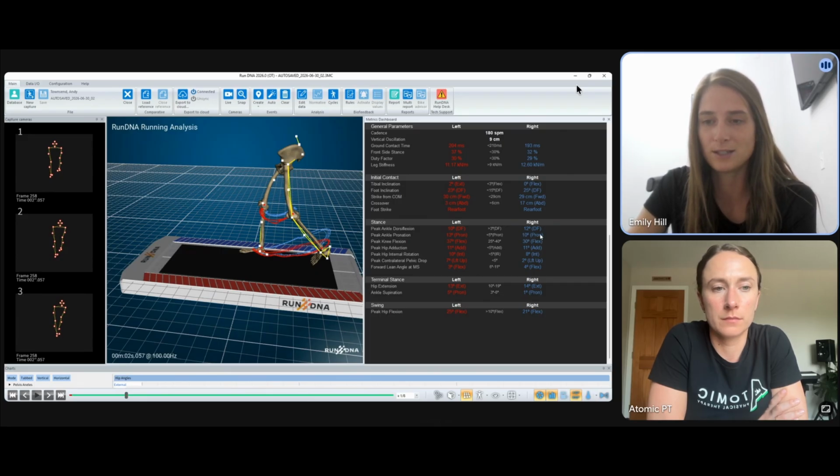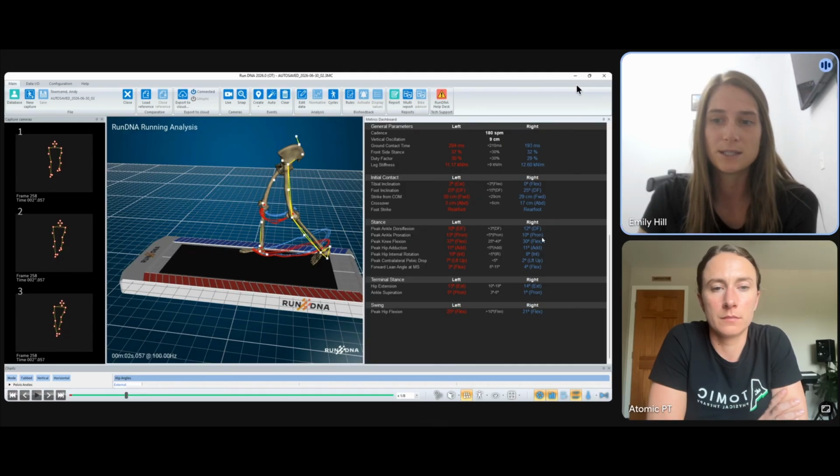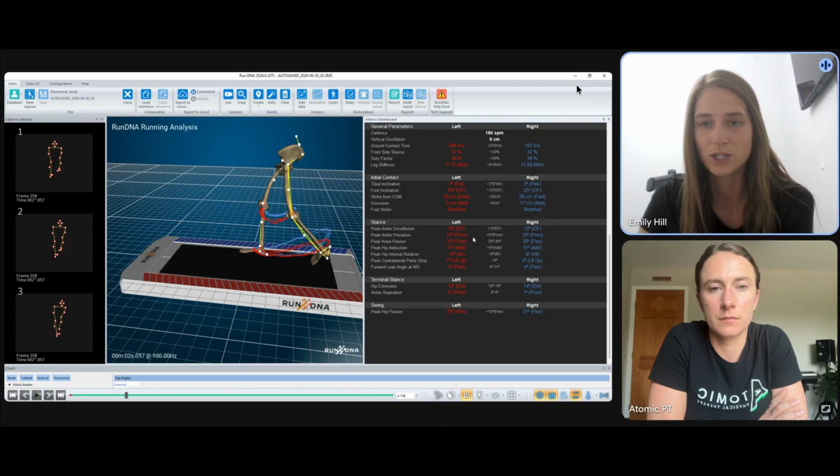We'll come back to this and talk a little bit about it, but sometimes it can happen if you're not getting enough dorsiflexion at the ankle, you start to compensate by rolling that foot in and getting a little bit more pronation to make up for that lack of range of motion that you have with dorsiflexion. Although we know, looking at the number above it, that Andy had plenty of dorsiflexion, so we're good there. Another thing that can lead to some overpronation is what's happening at the hips. So if your hips are collapsing in a lot, that can lead to more pronation at the foot. So we'll kind of continue. We're going to look at the hips here in a minute, and you might be able to tie that back to this pronation number.